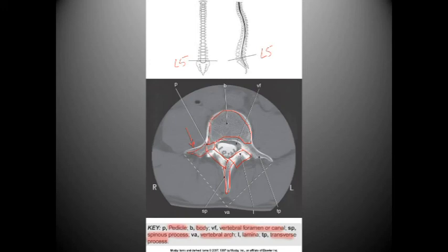This image looks very interesting because we have something inside the spinal canal, which I'm anticipating is some type of contrast material based on what we're seeing. So this could be something like a myelogram, something to that effect.